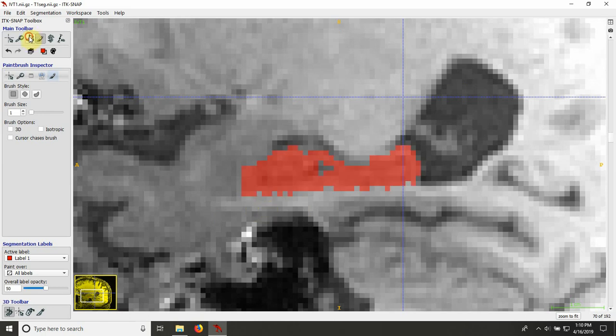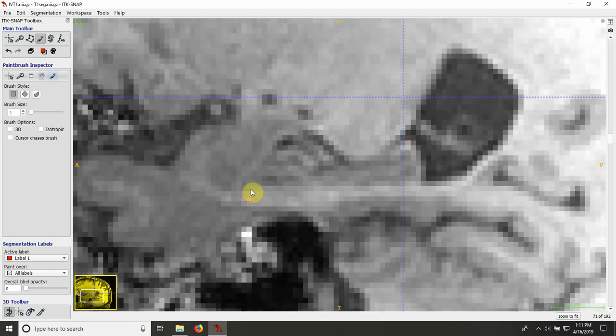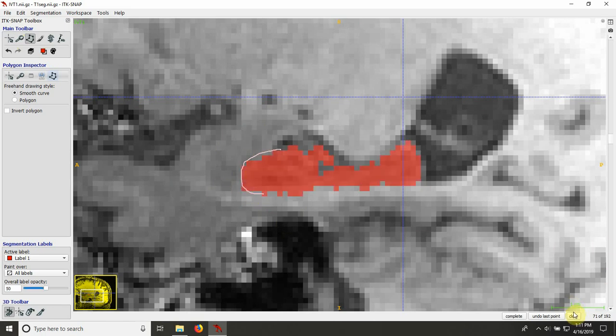Okay, and we're getting to the border with the amygdala, which is actually this region. And I'm being guided by these lighter voxels. So I think that's the border with the amygdala. So I think I can actually include maybe a few more voxels here. And here as well. So again, that would be this border. So some brighter voxels here, and then the rest is the amygdala.